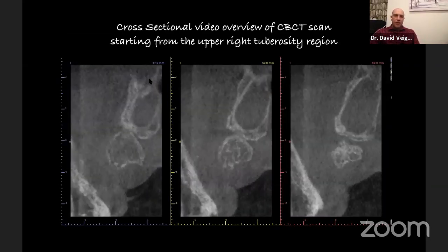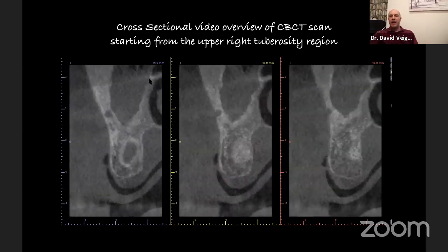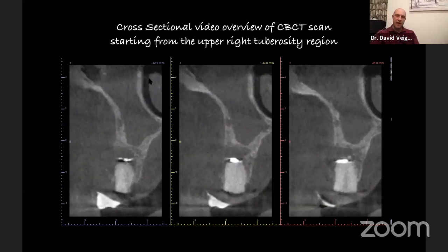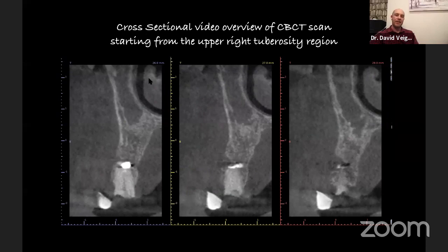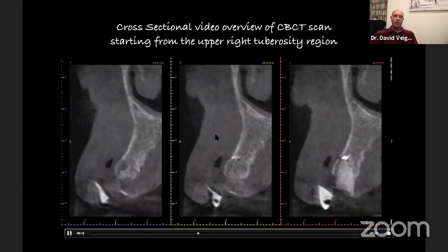As we move to the anterior portion, you'll see the patient has piles of bone, absolutely piles. Through the sinuses here, the little radiographic markers are the radiographic teeth in this situation. But look at the piles and piles of bone this patient has.